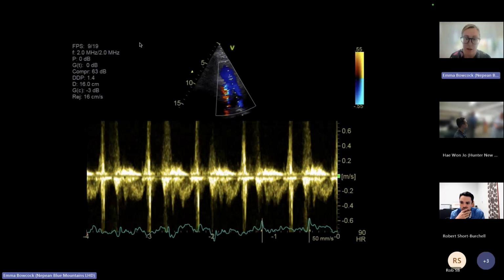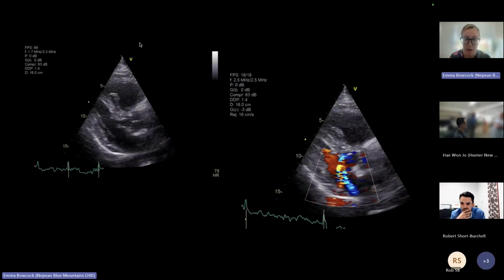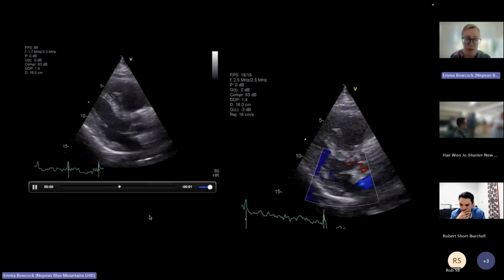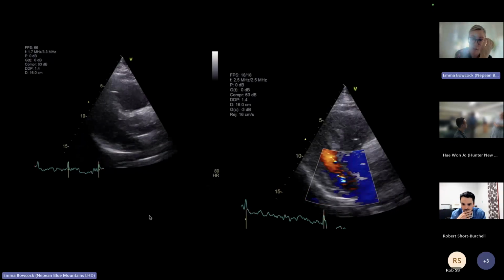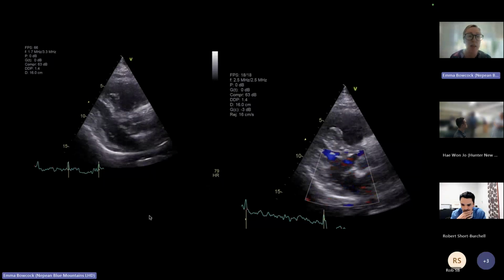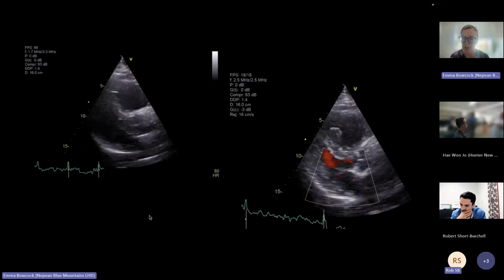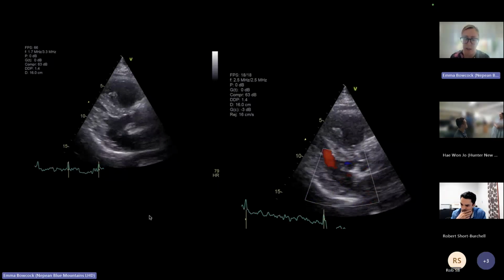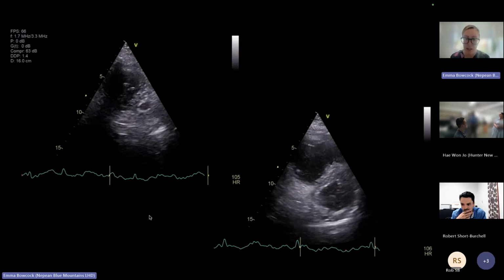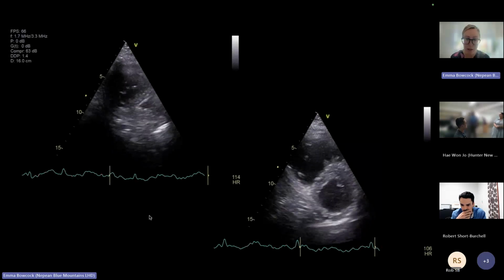So this is a case of an acquired PE whilst in ICU. I think you got all the pertinent features. Dilated right ventricular outflow tract. Maybe slightly low parasternal, but normal or hyperdynamic LV function, with no obvious flow acceleration or SAM that you could see. There's some mild MR, and then flattening throughout the whole cycle, consistent with severe pressure and volume overload.